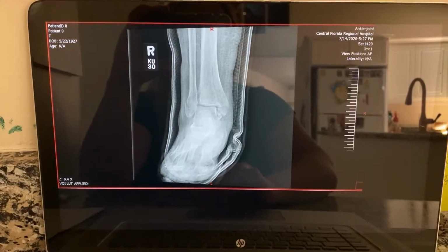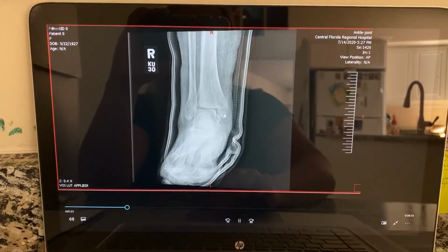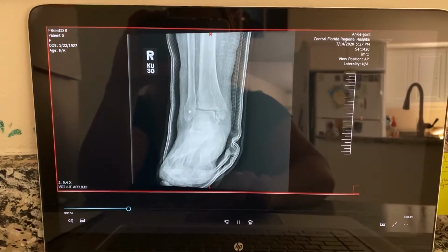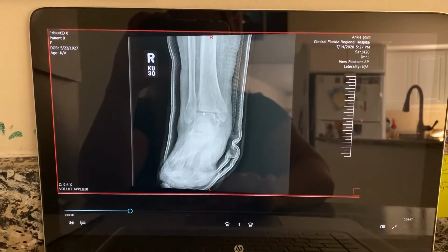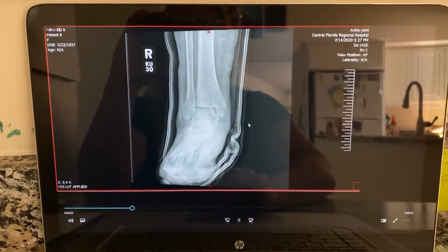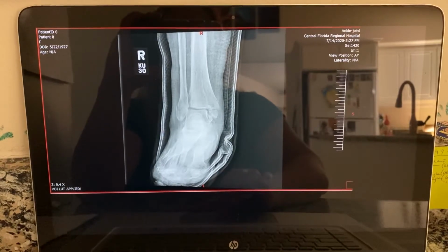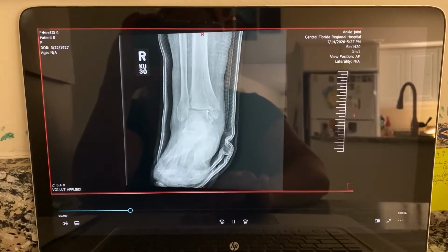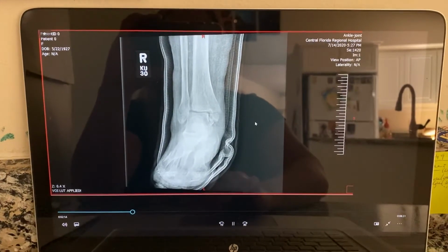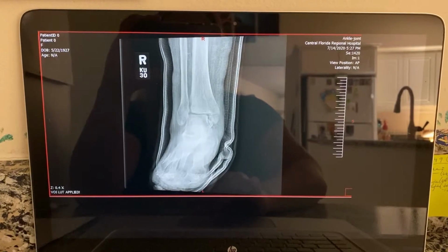The pathology present included a previous trimalleolar fracture, which is an ankle joint fracture that involves the medial and lateral malleoli, as well as the posterior lip of the distal tibia. The radiology report showed minimally improved alignment of the fractured fragments and mildly improved alignment of her ankle mortise, as well as vascular calcifications seen in other views and diffuse osteopenia.